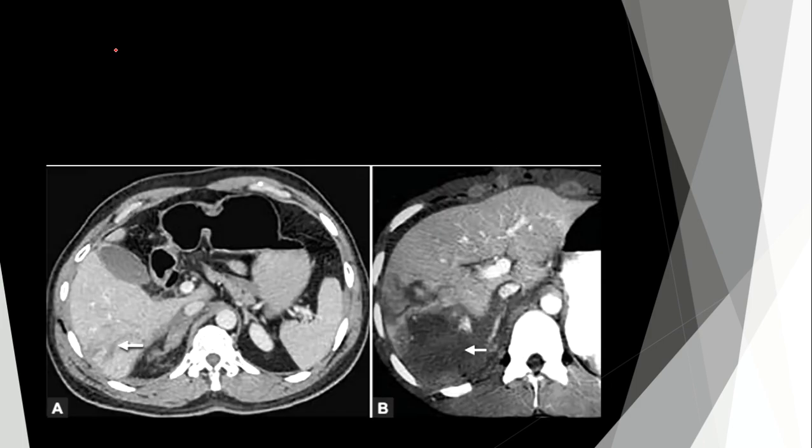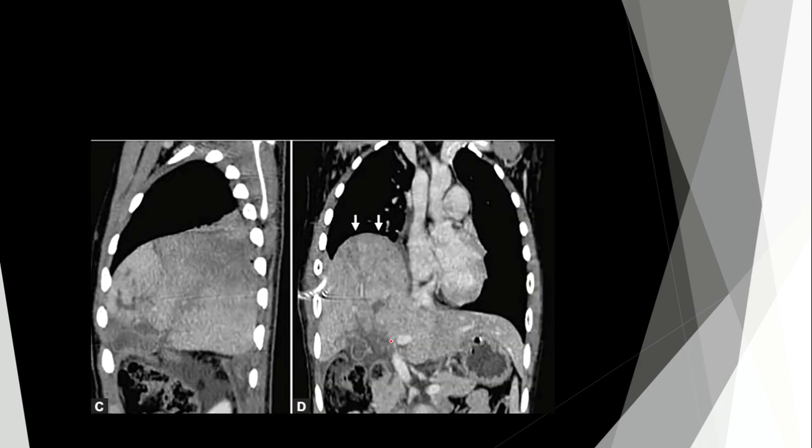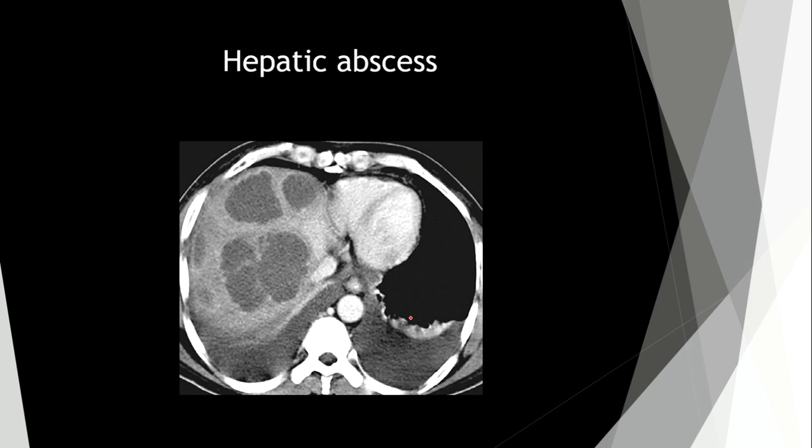And here we see laceration of the liver, here. And here we see laceration with hematoma. Different densities we see here. And another example, we have laceration with hematoma. Here we see different densities in the structure of the liver parenchyma.